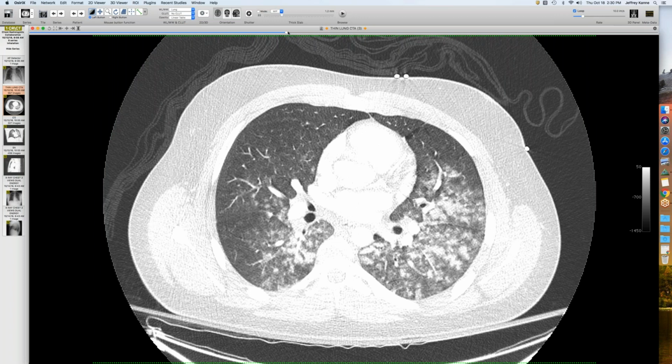So this is presumed from vaping some compound that somehow injured the lung or triggered an immunologic response that led to this hemorrhage. So Jeff, you said they did get some blood back on a little lavage. They didn't get the typical increasing bloody return, but they saw a little bit of old blood in there.